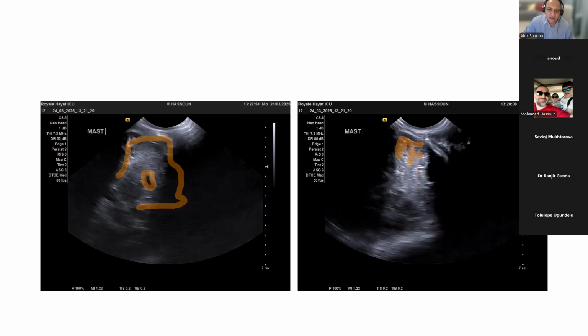And again, the importance of doing cerebellar images, and I'll talk about that on Sunday, is making sure that you don't miss a cerebellar hemorrhage in the cerebellar hemispheres, because you can get isolated cerebellar hemorrhage with normal ventricles with no IVH, and that has significant prognostic implications for preterm babies.